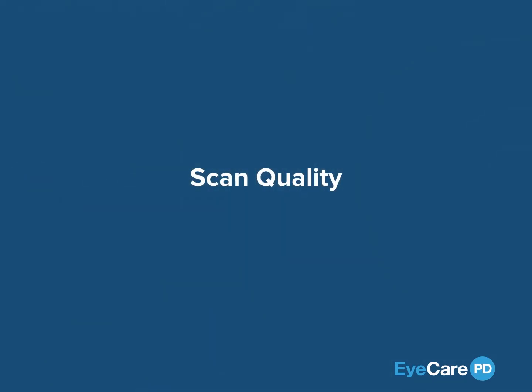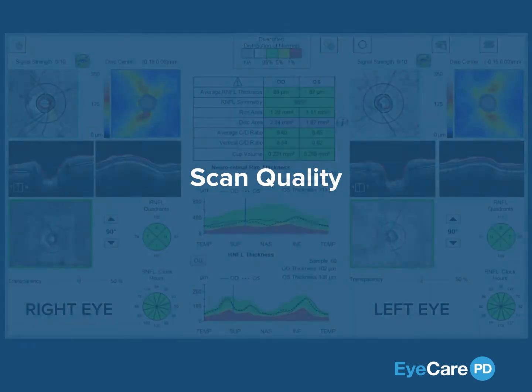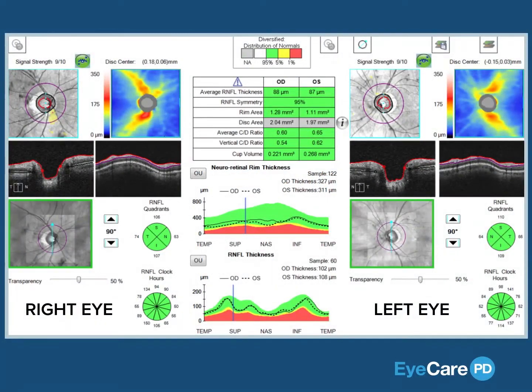Making sure you have an accurate scan is critical prior to beginning the interpretation of the OCT image. Before we dig in, let me remind you of some important terminology. This is a standard display when evaluating the optic nerve and retinal nerve fiber layer. The right eye is on your left.